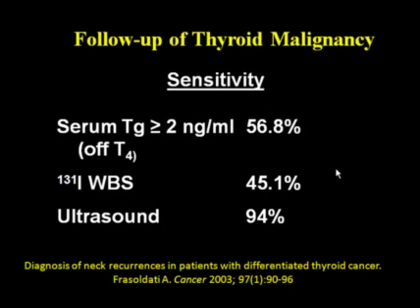Ultrasound of the neck has been deemed to be more sensitive than whole body iodine scans and serum thyroglobulin levels in detection of recurrent papillary thyroid cancer in the neck. At our institution, we no longer perform whole body iodine imaging for follow-up of patients with thyroid malignancy, and also this has been removed from the current ATA guidelines.